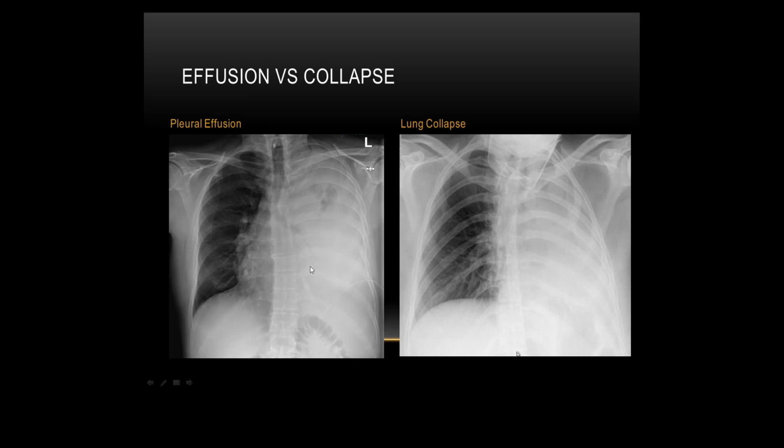Now, other things you can look for as well is widening of the inter-rib distance. If you've got something that's increasing the volume, it can sometimes push your ribs away a little bit, and this is a case of it here, but you might get widening of your rib spaces. If you compare it to a previous chest x-ray, you might see that widening. So it's always good to look at the previous chest x-rays in every situation. If you get volume loss in the lung because of a collapse, it might pull your ribs together and they become a bit more crowded.